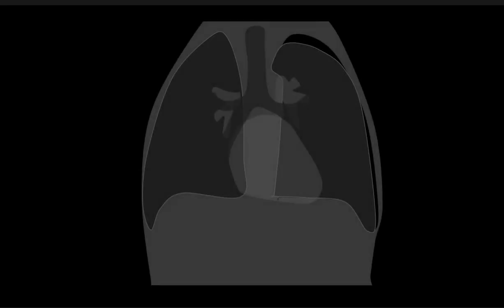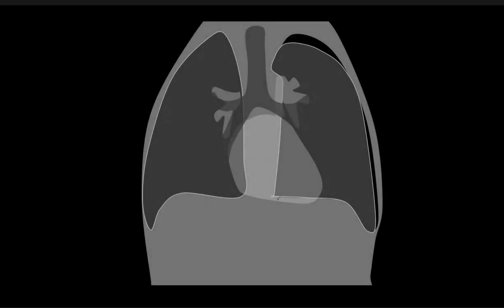So what does a pneumothorax look like? Well, it depends. What does it depend on? Well, it depends mainly on the position of the patient. So in this situation, we've got an upright patient, and we're going to talk about that first. These tend to be the easier ones to see, even though they can be subtle when they're small.